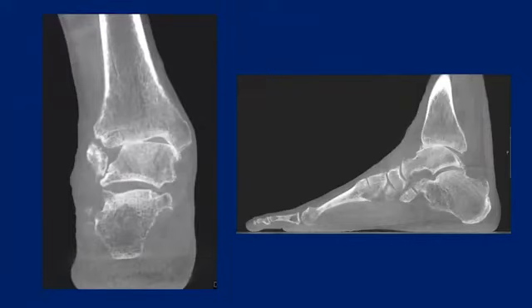Coronal and sagittal weight-bearing images where we can see this patient has osteoarthritis, right? It's pretty bad. Bone-on-bone apposition anterolaterally, there's subchondral sclerosis, probably a bit of underlying ligamentous insufficiency. We've got some anterior translation of the talus. But more importantly, we can appreciate on the coronal view the marked valgus deformity at the ankle, which would need to be addressed at the time of surgical correction, likely arthroplasty in this patient.